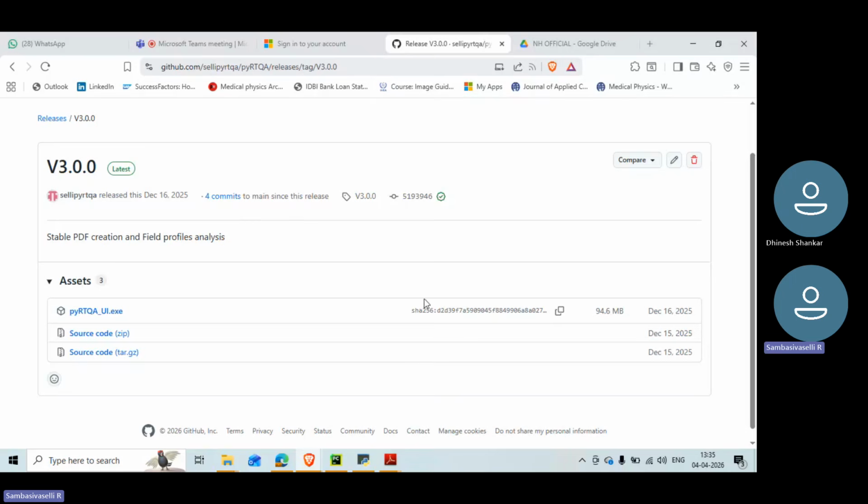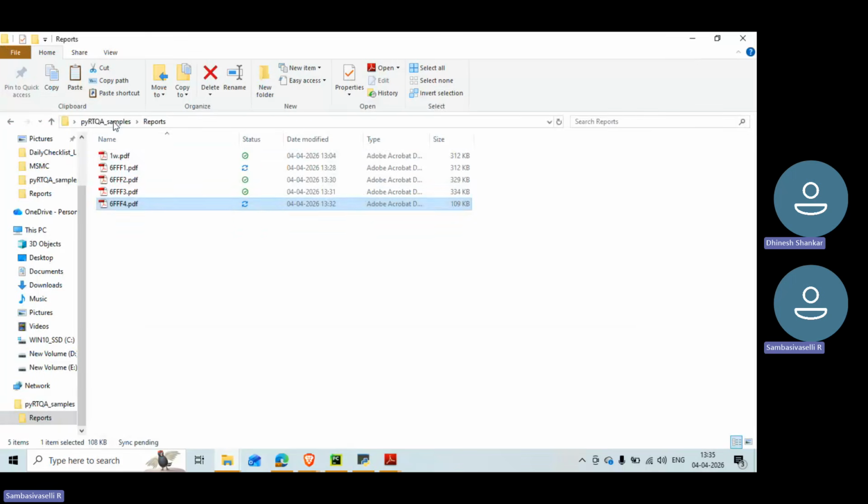Over to Mr. Dinesh. Thank you, Silly. Can you please show the RFA data which is converted in Excel format? Yes, sure.